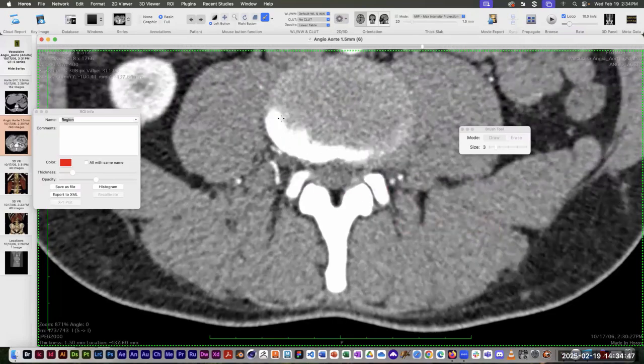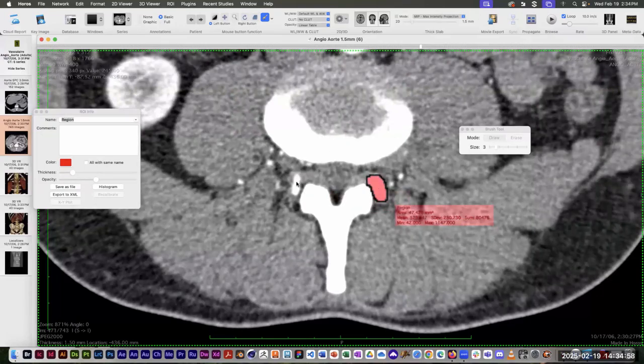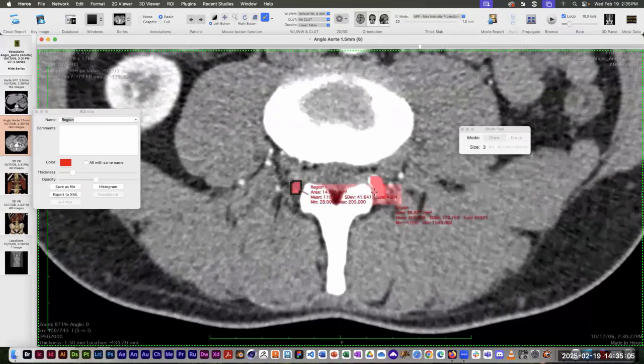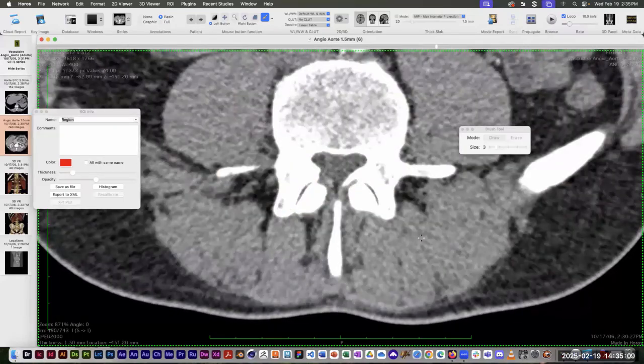You see some white starting to show up here for the vertebral body, but that's the body of a different vertebra. So I just need to finish up this tiny little bit of these facets. Now then I got to go the other way because I know I missed some the other direction. So if I go down this way, okay.